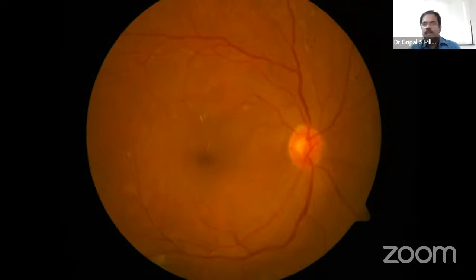Yash, can we start with you? Okay, sir. This is a color picture of the right eye of a patient. You tell the findings first. The media appears clear. Optic disc margins and color look normal, with a cup to disc ratio of about 0.3 with a healthy neuroretinal rim. Vessels over the disc look fine. There are a few microaneurysms along the vessels seen superiorly as well as inferiorly along the arcades.